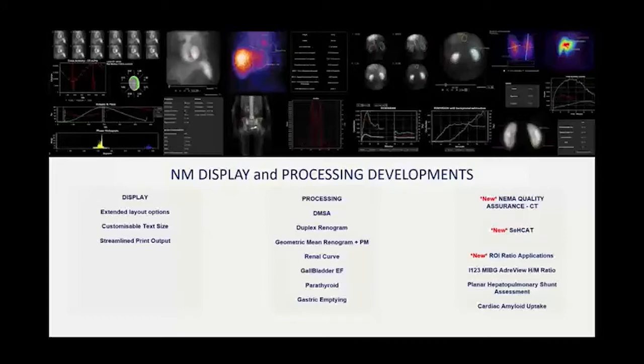Also, very importantly, you told us that you wanted the print output to look nice, and obviously very professional. So there have been a lot of changes made within the Hybrid Viewer environment, which will hopefully deliver that for you. I'm going to show you today some examples of prints and some of the tools that will be useful both to improve the display, to facilitate your workflow and processing, but also so it looks good when it gets sent to the referring clinician.